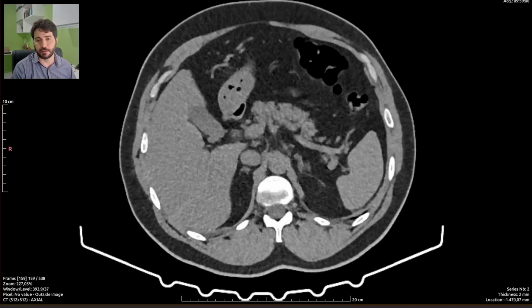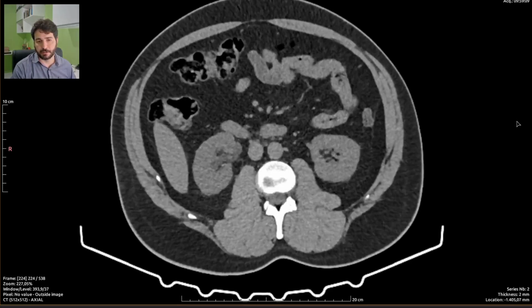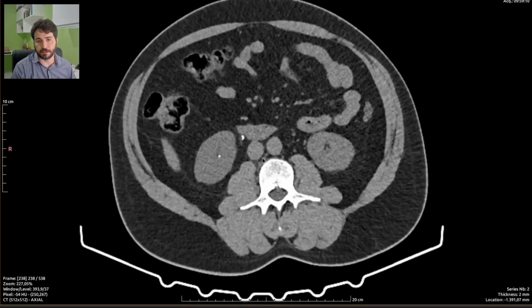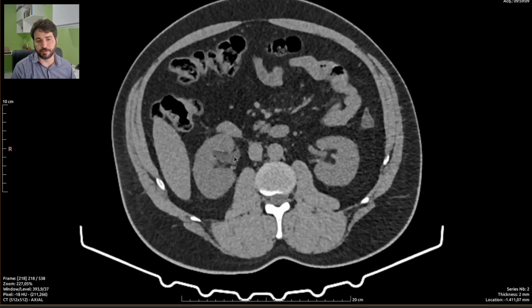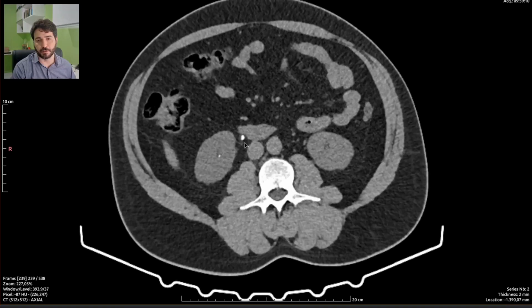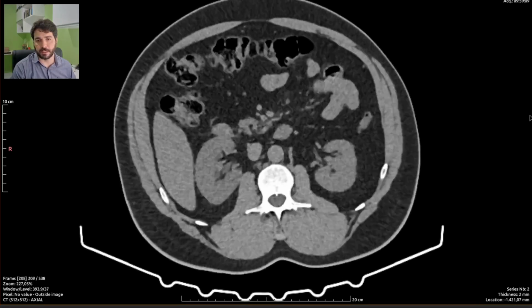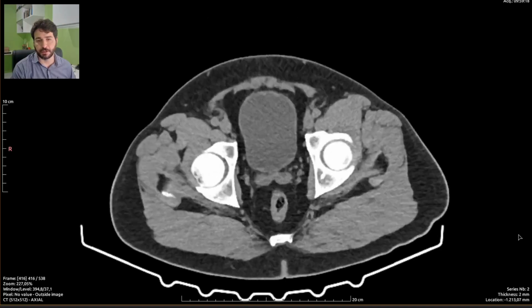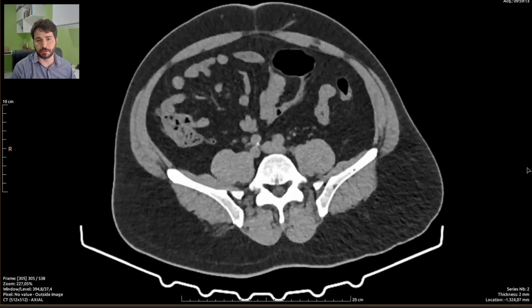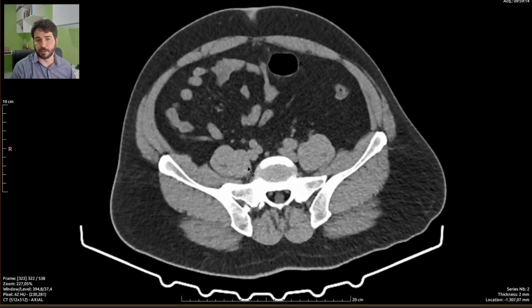There is at least a mild, I can say this is a mild steatosis of the liver, and indeed there is a stone right here on the transition from the pelvis and the first portion of the ureter on the right, which makes it very clear this is actually the cause of the right-sided pain of the patient, as his doctor has mentioned on the exam ordering.